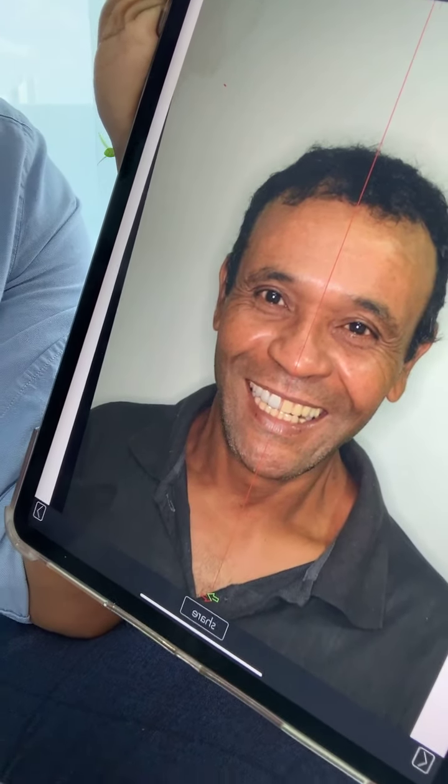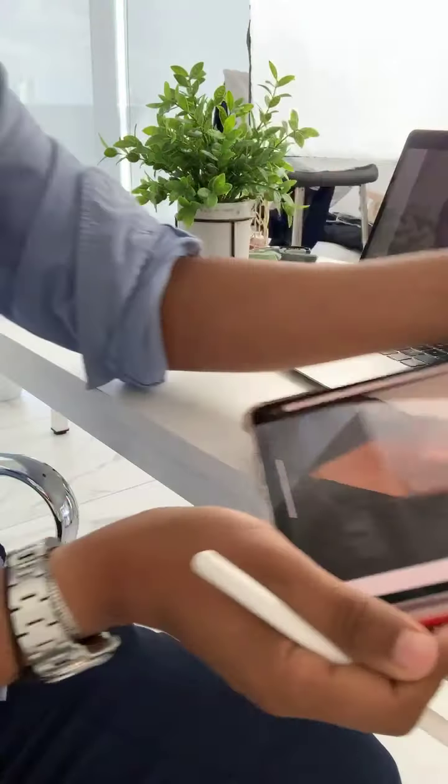So what do I get from this smile simulation? Well, as you guys know, smile simulation is a great way for you to better understand your patient's wishes and desires, and it also gives you a better understanding of what exactly your patient is looking for. Imagine if I did not have a smile simulator such as SmileFy in my practice. I would have to tell my office, all right, I want a teeth shape that is somewhat triangular. Send me something. Let's do a trial on my patient.